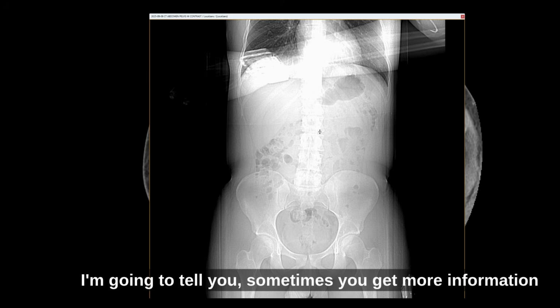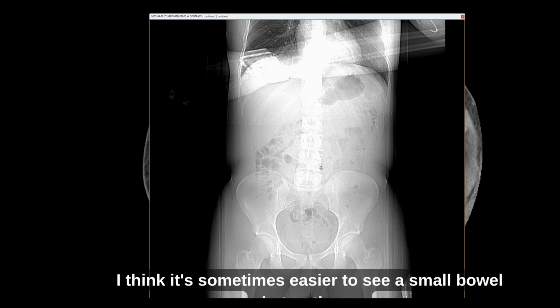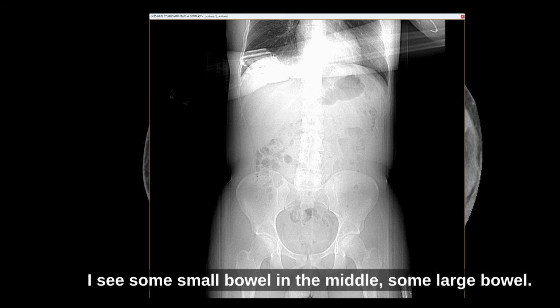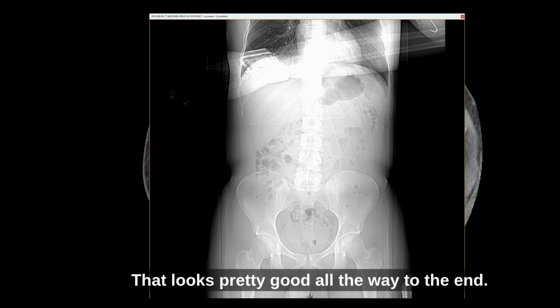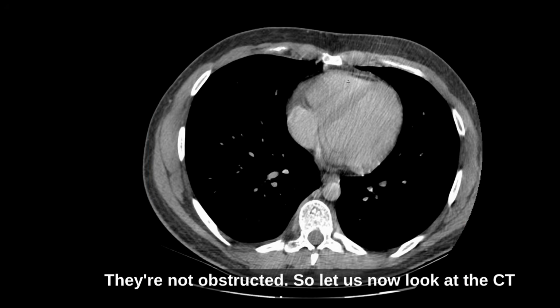Sometimes you get more information from the scout for the bowel gas than you do from the actual CT scan. I think it's sometimes easier to see a small bowel obstruction on the scout than the actual images. For me, I see the stomach here, I see some small bowel in the middle, some large bowel. That looks pretty good all the way to the end. They're not obstructed. So let us now look at the CT images.